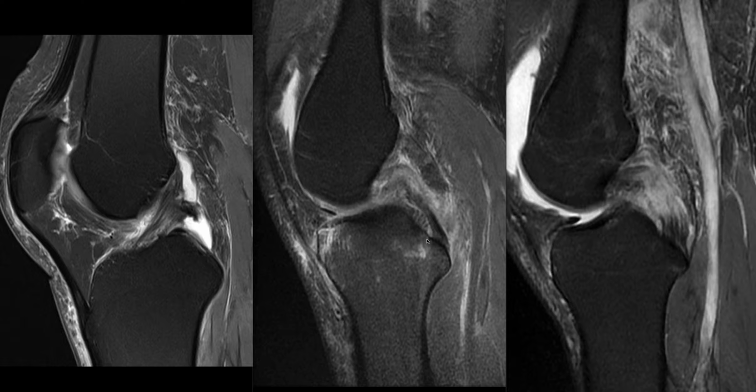signal on MRI. And the morphology also affects its appearance when it is injured, because often, even though there's a complete tear of the fibre bundles, much of the hemorrhage and edema remains contained within the sheath. So it's not surprising when, even with a high-grade tear, the overall shape of the posterior cruciate is preserved. And that's the case really in these two injuries.